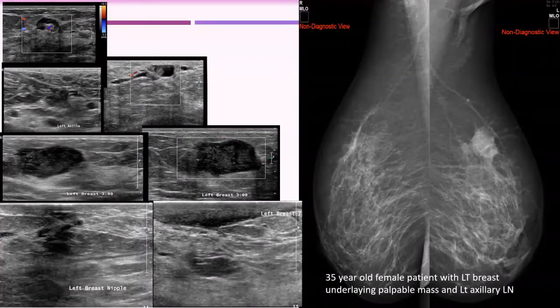Okay. And the central vascularity, what does it indicate? It indicates inflammatory or reactive lymphadenopathy rather than being suspicious. Okay. And this is what? This is the retroareolar mass. It demonstrates ductal extension, ductectasia with internal component. Okay, and that is the lesion you have seen on the mammogram.